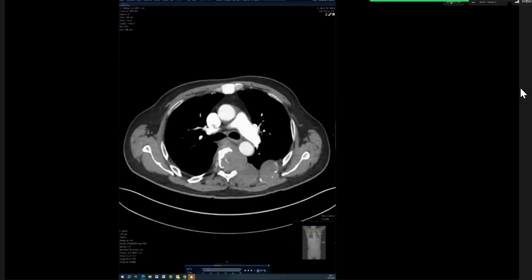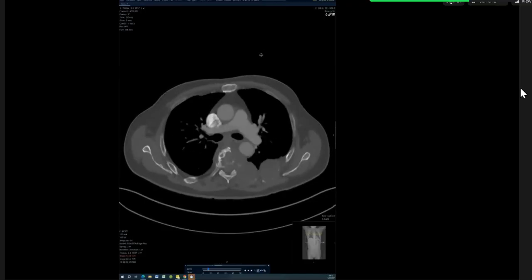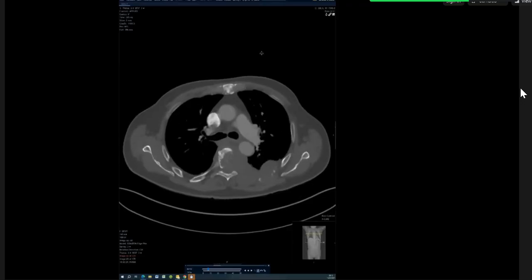And also here I can see that the spinal cord is involved with the soft tissue mass, and there's invasion of the thecal sac, and complete soft tissue opacification of where I would expect the spinal cord to be. I would be very worried about spinal cord involvement, and I would contact the orthopedic team, alert them about this patient, and then follow up with further imaging, potentially an MRI, to assess the spinal cord.